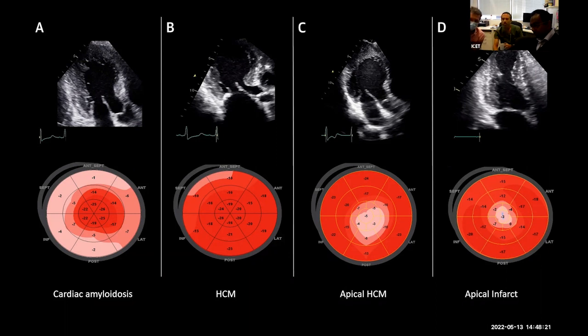Exactly, and here you can see that it's white, so you've got a negative number. You see it says -3, -2, -4, whatever. So it would have a positive number, and that would mean it'd be going in the wrong direction. So that's where it would be blue. Yeah, there's a sniff of blue there under the negative. I couldn't see from back there. You're right, there's a sniff of blue. All right, it looks pretty white from back here.